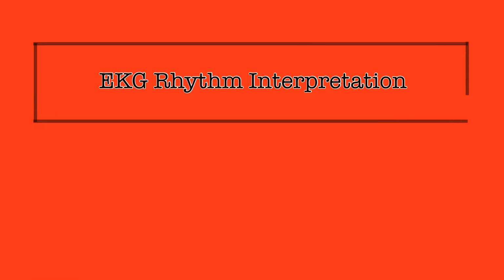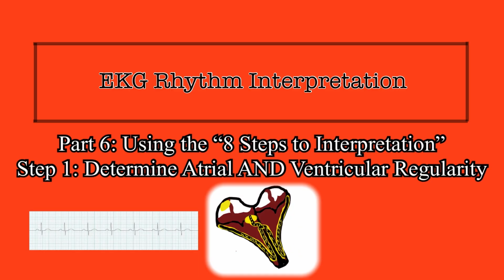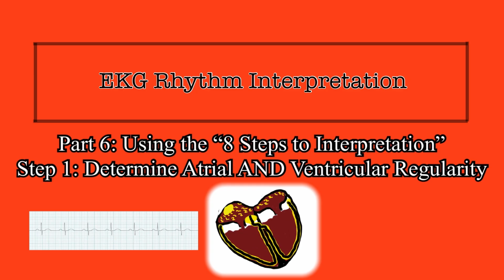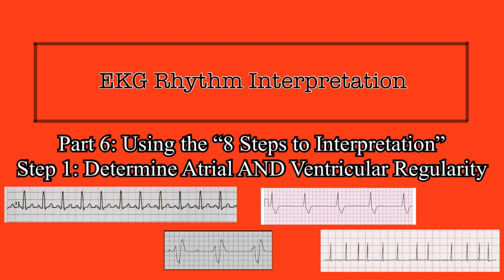In parts 1 through 5, we took a close look at a heartbeat, taking what's happening in your chest and connecting that to what you're seeing on the strip. But we used a perfect heartbeat for that lesson. If all heartbeats were perfect, we wouldn't need to interpret rhythms, so now we need to start breaking down the pieces of a rhythm so that we can efficiently identify anomalies on a strip to alert us to problems with conduction and ultimately with delivery of that life-sustaining blood that comes from every beat.